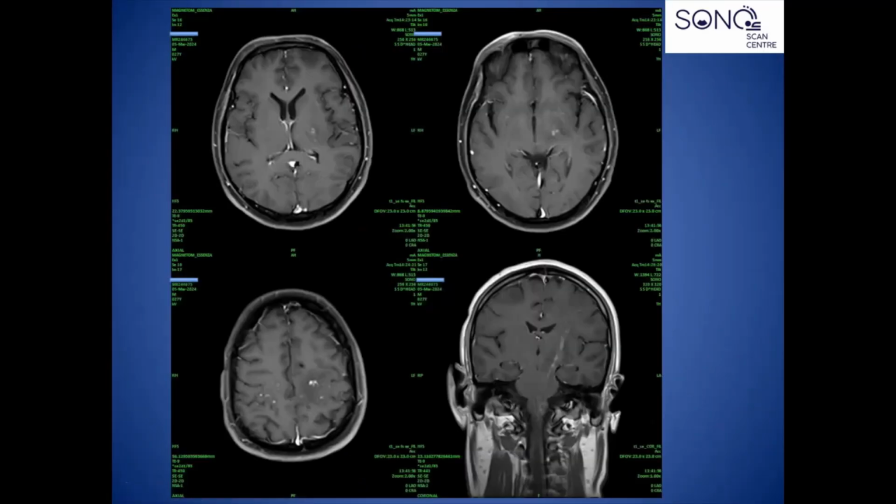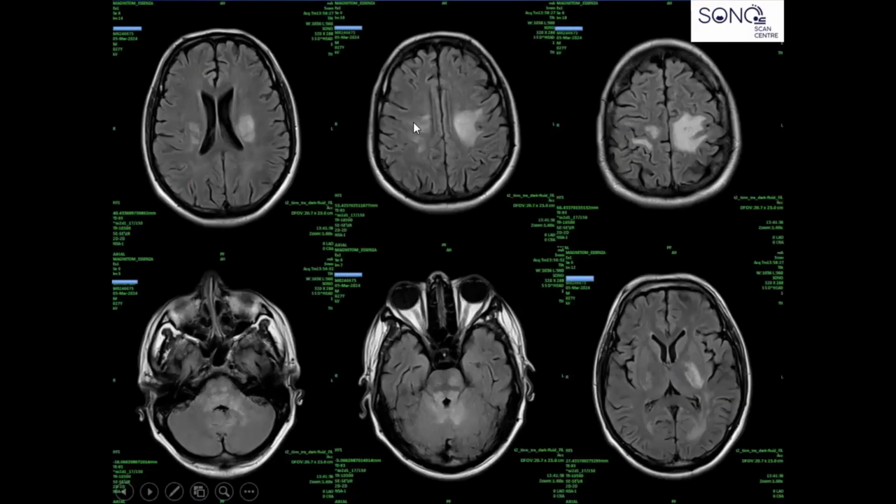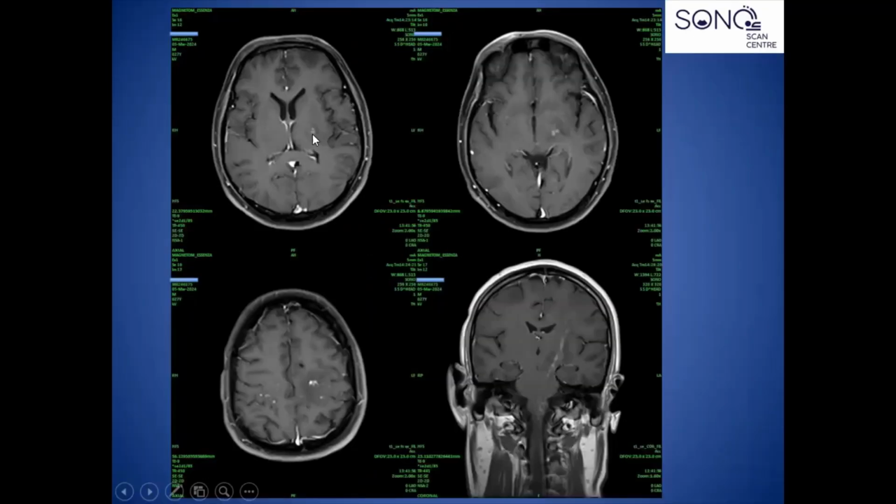The same case with the contrast, right? So the hyperintense lesions are noted in the plain images in FLAIR axial, but in contrast, only a speck is noted. That is where the enhancement pattern varies. It is not mandatory that all demyelination should have an enhancement. Only one speck is noted here, right? Only these kind of specks are noted for such large lesions, what we saw in plain study. This is a coronal image of a T1 post contrast. This is a strip-like pattern type of enhancement noted.